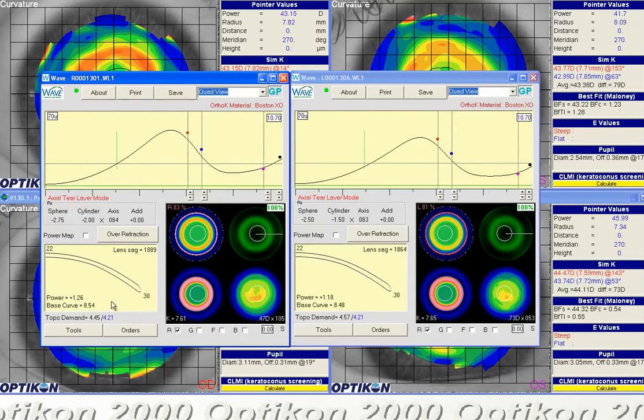It's pretty basic. If we want another diopter, then I would just increase the demand so that we're about plus 2.25 or 2.26 or so in 100% mode here. So we're just going to increase demand until we're at right around 2.25. We're in RSIM, so it should be pretty stable throughout every meridian, and it is.